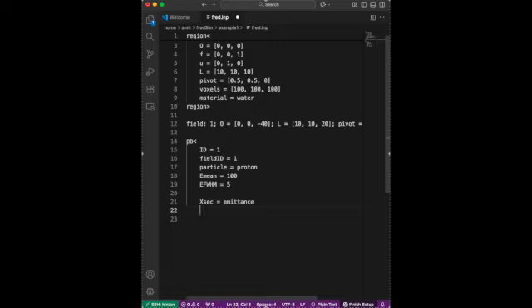That's one of the properties of a beam. And now I am going to define the twiss parameters for a certain beam size. So if we have a certain beam size, we can find out the emittance, the twiss parameters, by this equation, which I'm going to show right now.